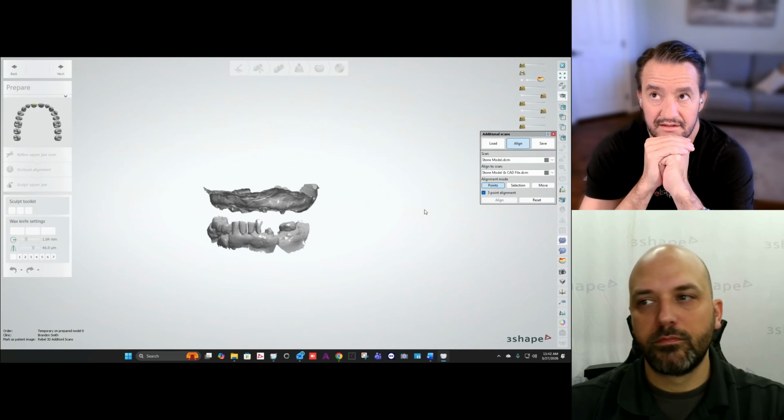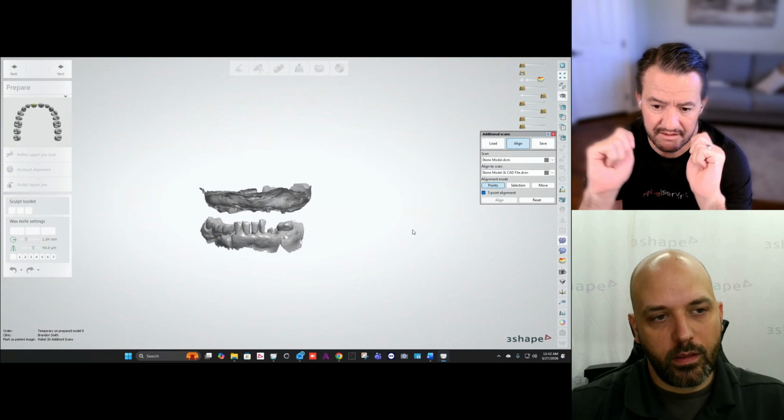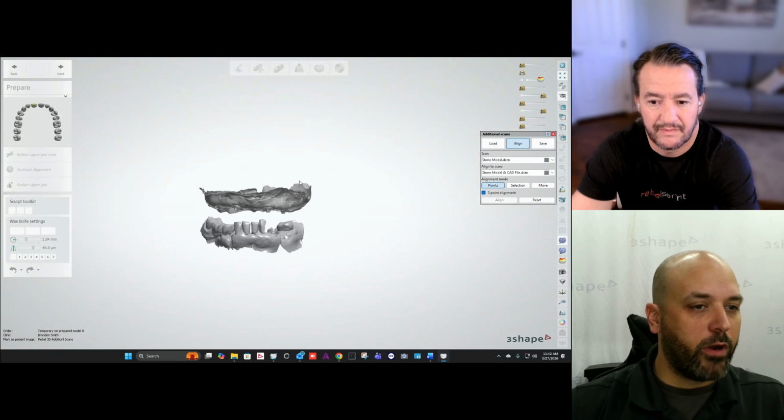And the vertical alignment you're working from is the intraoral scan. Yes. And then did the doctor use a leaf gauge to capture the bite? No, they used the temporary bridge that the patient's currently wearing for the bite.